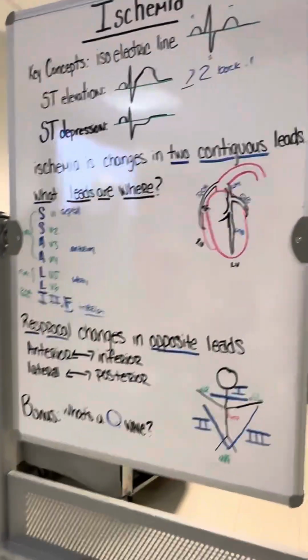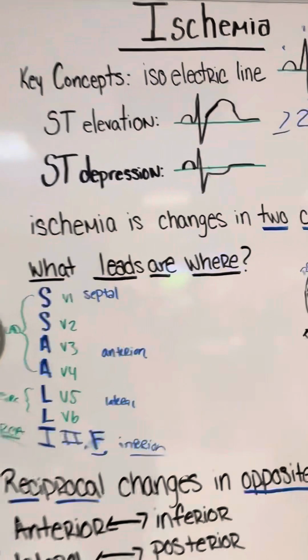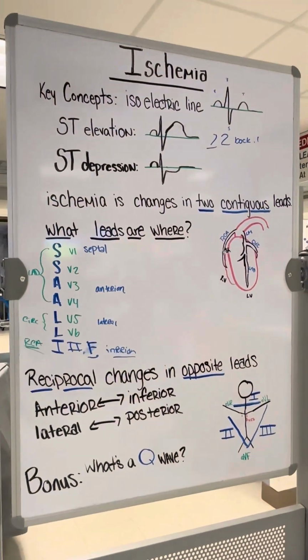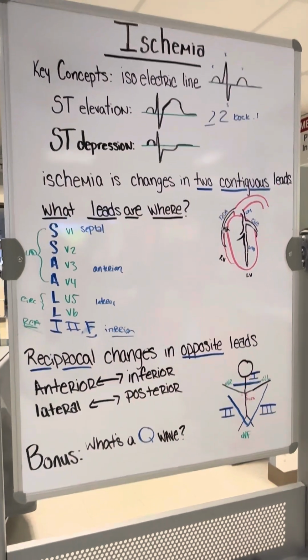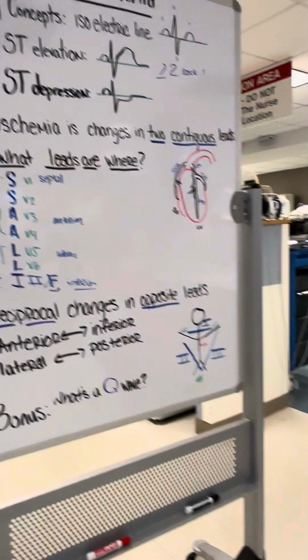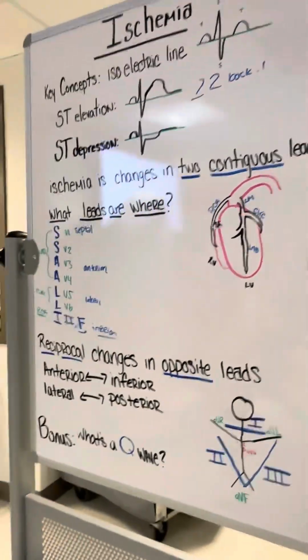So these are 2 different ones. When I'm talking about the isoelectric line, I look for the one with the most flat. This one's pretty flat for me. If you literally take a piece of paper and line it up, that's the isoelectric line. You see how, especially in V5, the P wave takes off from there and returns to there. The QRS takes off.